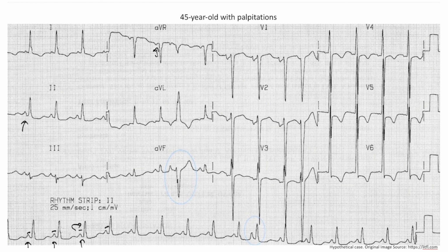However, notice this specific P wave. Now, unlike the other P waves, it's happening faster than you would expect it, and also the shape of the P wave is different. So this would be an example of atrial depolarization that's occurring prematurely and not originating from the SA node, as evidenced by the change in the shape of the P wave. So this would be a PAC.